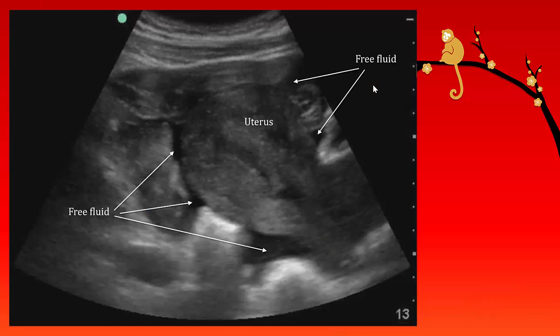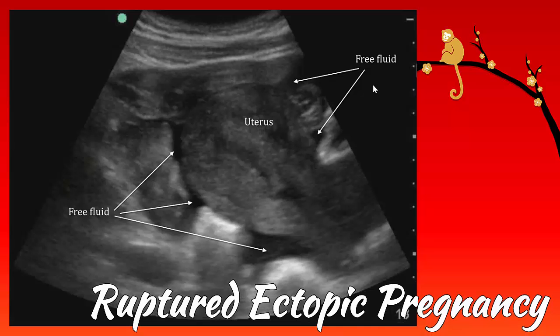So here we have abnormal. You can see a slightly enlarged uterus with free fluid. Now, this patient is a ruptured ectopic pregnancy, and if you happen to have this image on the exam and you were given a stem with a positive pregnancy test, then this would be a ruptured ectopic pregnancy.